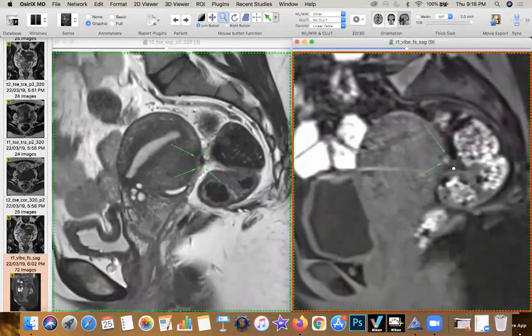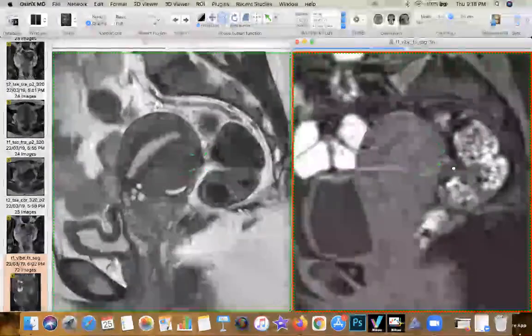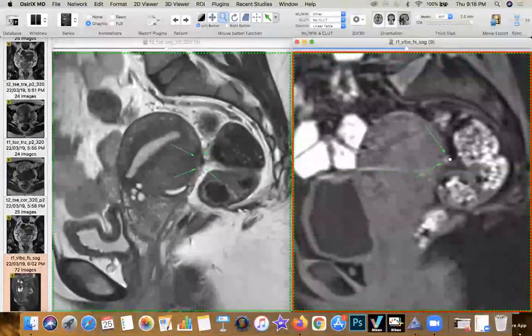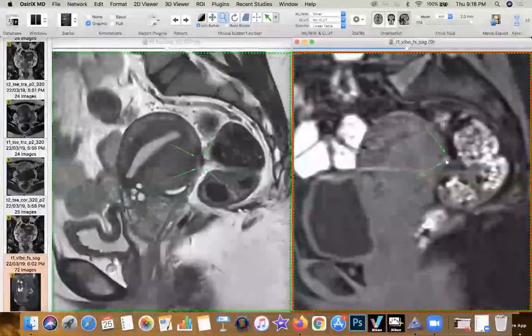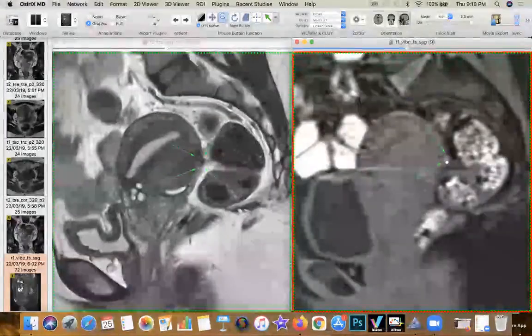Now, why would mucinous matrix come in this location? It's a very unusual location for mucinous matrix. You do get them, of course, when you have pseudomyxoma peritonei of ovarian origin, or appendicular or colorectal in origin. But here there's no other ancillary finding to support the diagnosis of malignancy.